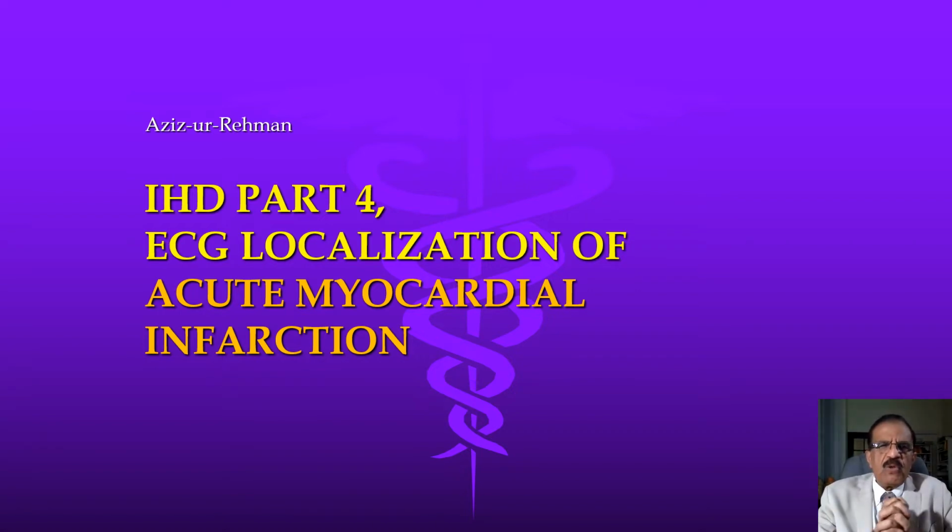So today we are going to discuss the role of ECG, first in establishing the diagnosis of myocardial infarction, and two, in its localization. Of course, the ultimate would be angiography, but you can have a reasonably good idea which vessel and which part of the myocardium is affected.